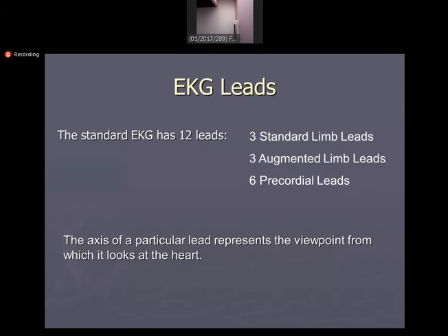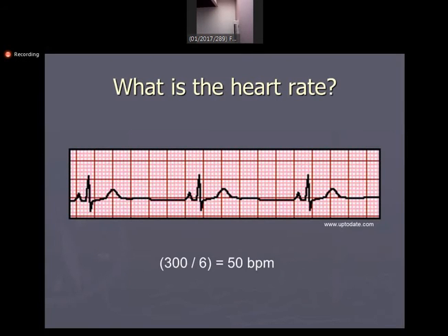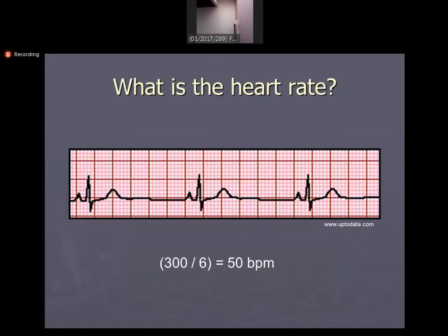Now, how many of you can identify in this slide where the P wave is? How many participants are here? 253 participants. How many of you can recognize or identify the P wave here? If more than 50%, it is good. If it is more than like 80%, it is very good. The P wave is the first deflection. Here you can see a P wave.